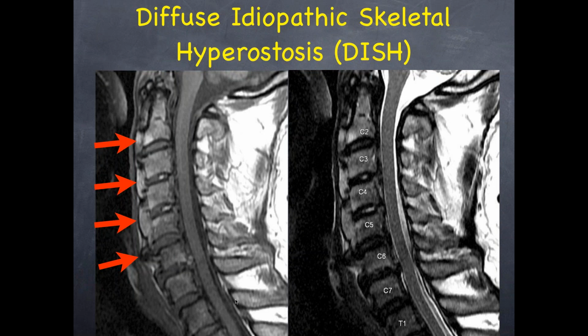But in terms of imaging, though, it's bright on both T1 and T2, right? Yeah, it's bone, so it has fat, regular marrow fat. Oh, I see what you mean. So it's producing marrow then. Yeah, marrow fat is seen within it here. Okay. It looked like just fat.